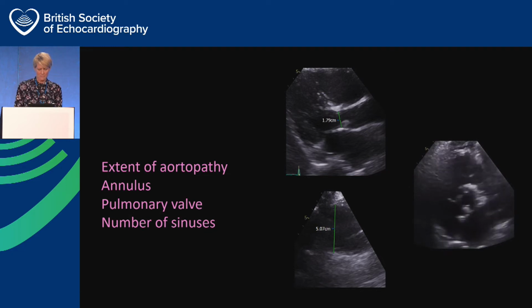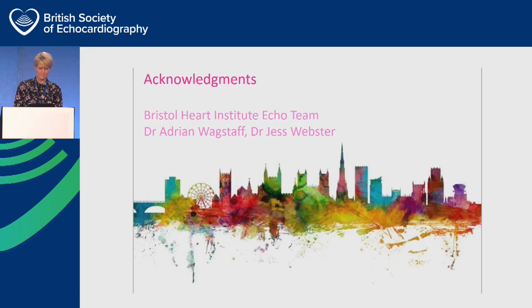in end systole. And of course, the arch is really important. So they want to know how much of the aorta they need to replace. Of course, we do CTs and MRIs on top. And the number of sinuses is also important. I mentioned the bicuspidization type repair, but we often do an operation called the Ozaki operation, where they make an aortic valve out of autologous pericardium. And you need 3 sinuses to do that. So you need a nice symmetric valve with 3 sinuses.